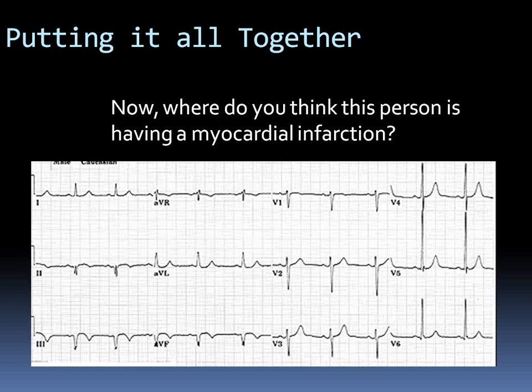So is there any other lead besides lead AVR that is having some ST elevation? Now this is a tricky one. Just look at lead 3. There is very slight ST elevation in lead 3. You see that? There is very slight ST elevation in lead AVF.